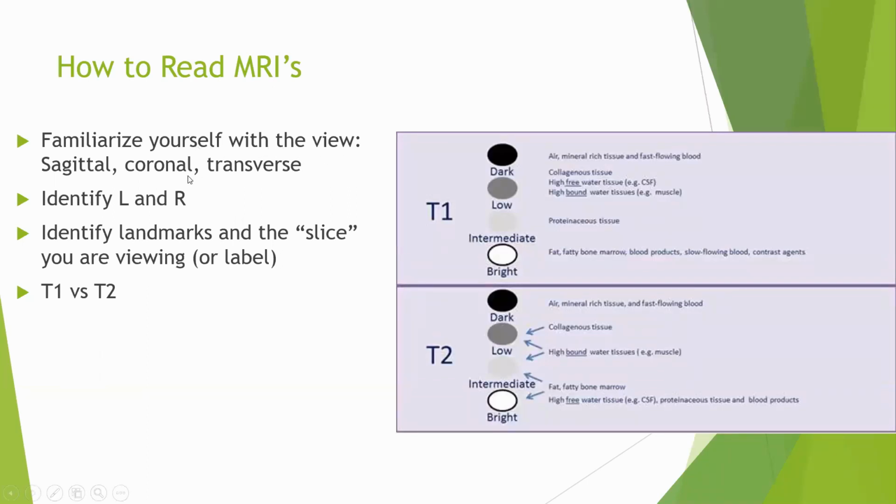On the top, usually on the top left corner, sometimes on the top right corner, you will see that they have put the entire region, if it's a lumbar spine, low back, they will put a lumbar spine in there and some dotted lines. Those dotted lines are the slices that you are going to look at at the bottom of the MR scan. So under the MR scan, there could be 16 slices, 32 slices, depending on how expensive the MR machine or equipment is, the number of slices will be more, right?